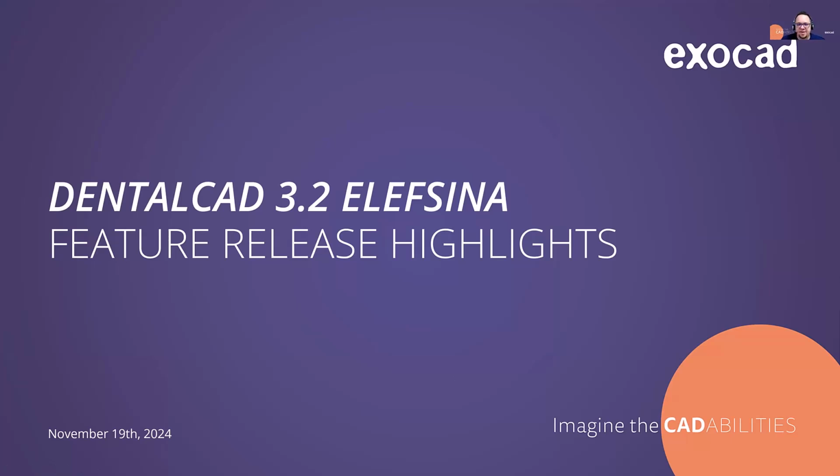Sure. For today's session, we are going to demonstrate the ModelCreator workflow, and then we're going to proceed on through to generate a mock-up design, so a wearable wax up for the patient, and then we'll proceed through ModelCreator to show how to create a digital wax up model.